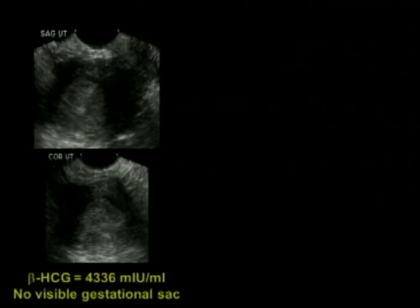So here's an example of a woman who came in to the emergency room at my hospital. She had an ultrasound done. She was having a little bit of pelvic pain. She had a beta-HCG that was over 4,336 milli-international units per ml. And as you can see on these two views, sagittal and coronal or transverse views, nothing is seen, no fluid collection is seen in the uterus.